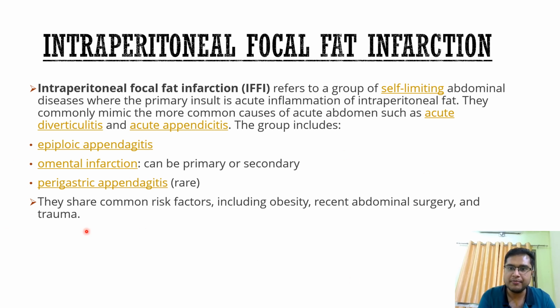And in this case, this female was very obese, as we can see, and the liver parenchyma also has diffusely reduced attenuation, suggestive of fatty infiltration.